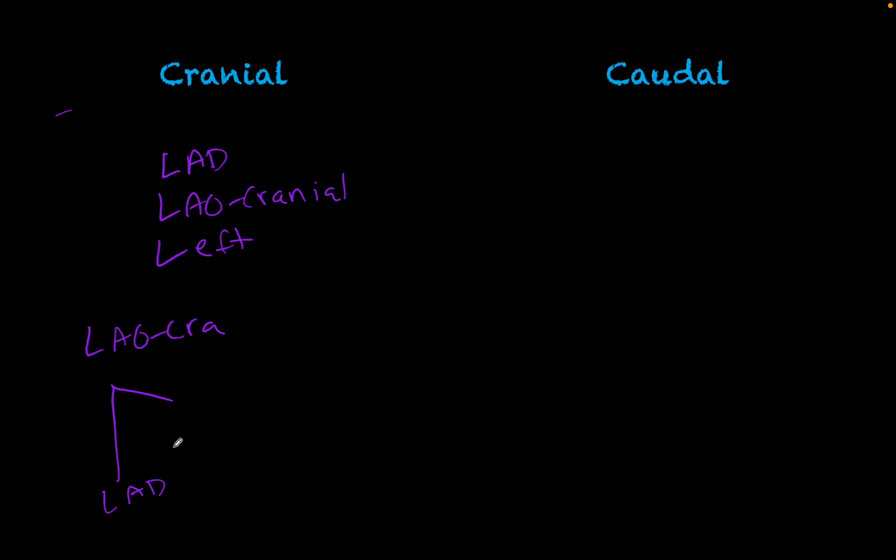I know that the LAD, in relationship to the circ, is actually the leftmost of the 2 vessels. And when I say left, again, I want to reiterate that I'm not talking about to the patient's left, I'm talking about to the left of our screen. I can then use this mnemonic to work backwards and know exactly what's going on in the caudal views, because the caudal is just the opposite.